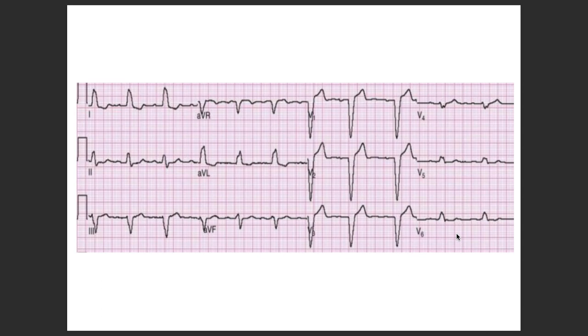Exactly. So this is a wonderful. See, you're intelligent. Okay. However, I'm not going to show that example because that is again out of topic. But the reverse is V1 will be positive. Okay. V6 may or may not. So the key is always, try to see on the V1. Okay, that's what is always the key.